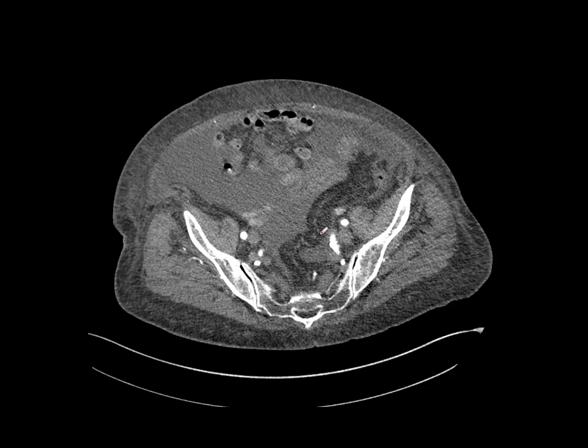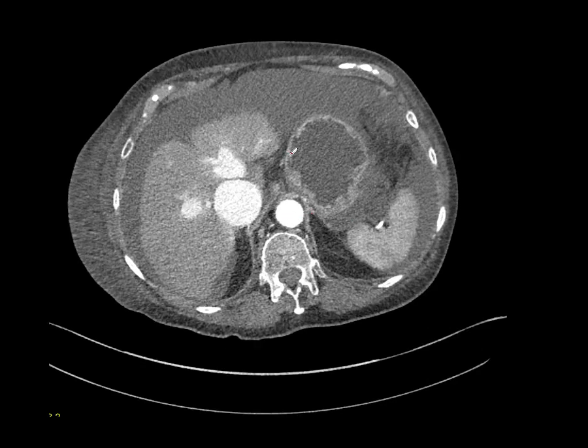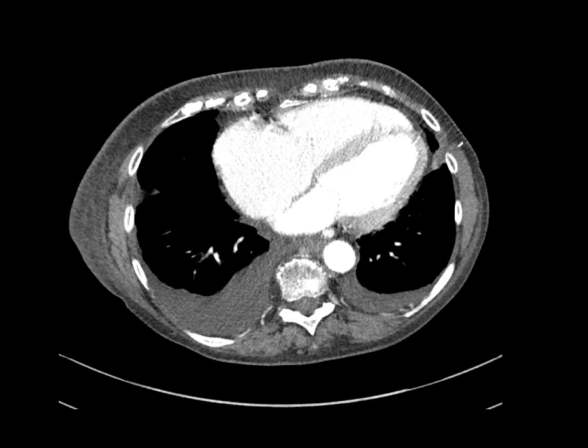But this was a portal venous phase scan, so 60 to 70 seconds after the injection of contrast, and you can see we've only got arterial flow here, so it's a very arterial phase scan. And when we get back up to the heart here, we can see there's quite a lot of ascites, and we've got grossly dilated hepatic veins and a large IVC, bilateral pleural effusions and a large heart. This patient had heart failure, and heart failure, of course, is a common cause of ascites. And so this patient came with ascites.